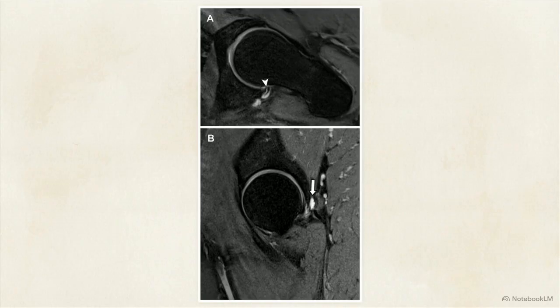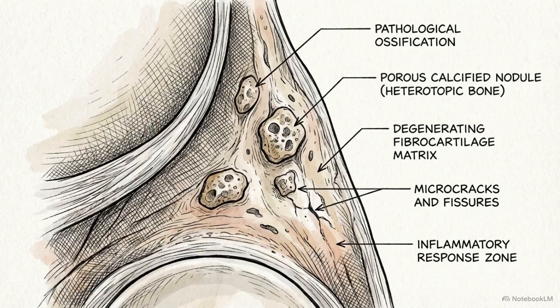This image shows a prominent fluid-filled cleft alongside a large encapsulated mass, known as a paralabral cyst. The presence of a paralabral cyst is highly diagnostic, correlating with full-thickness labral detachment tears in 94% of cases. In chronic cases, labral degeneration can lead to ossification within the tissue.